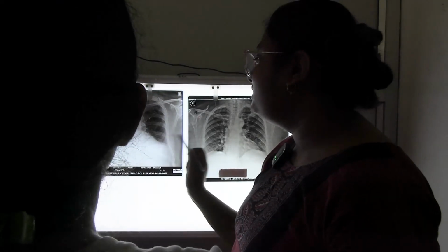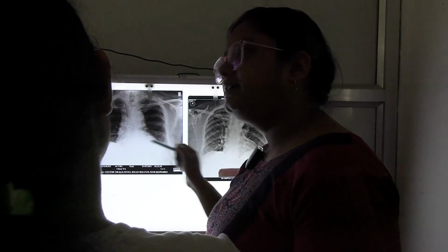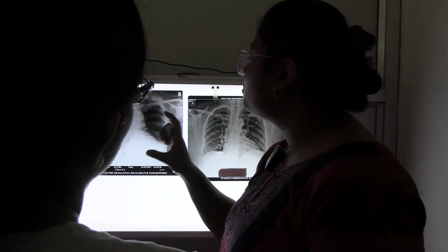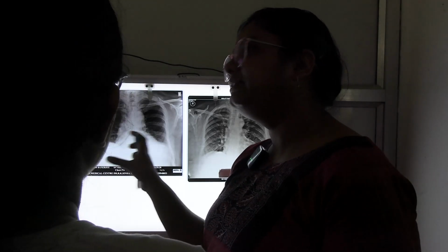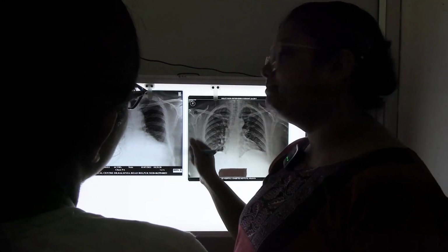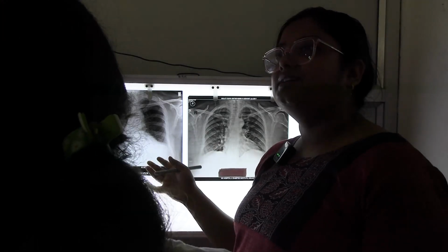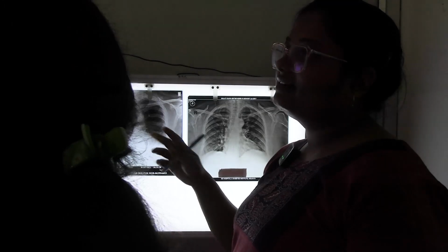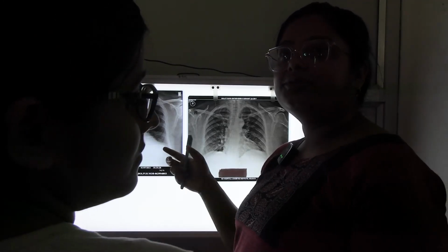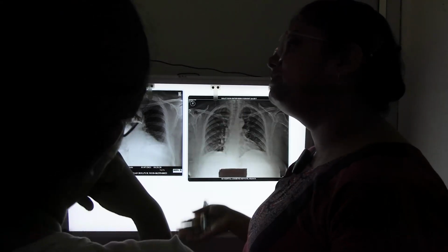Here also, another is the cardiothoracic ratio, the ratio between the widest width of the thorax and the width of the cardiac shadow. It is almost half. If it occupies more than half of the width of the thorax, then there is an increased cardiothoracic ratio, and it generally occurs in hypertrophy of the heart, hypertrophy of different ventricles, or pericardial effusion, a fluid collection. If fluid collection occurs in the pericardial space between the parietal and visceral layers of the pericardium, then there will be an increased heart shadow, and the cardiothoracic ratio will increase.